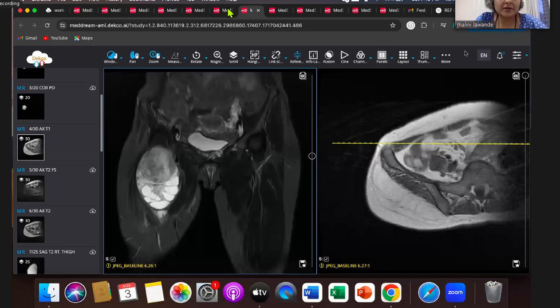Yes, so if they have an atypical lipomatous tumor, the septae appearance is very thin, maybe 1 to 2 millimeter. It will not be thicker. For liposarcoma, CT can help, but the soft tissue resolution would not be good enough for the vessels and all of that. So MR would be enough, and even without contrast, on MR you will be able to make out that solid component on the plain scan itself, but we can give contrast to show that it is enhancing.